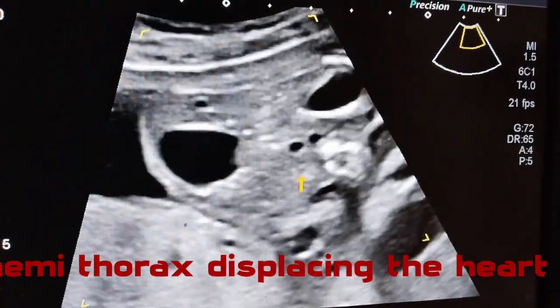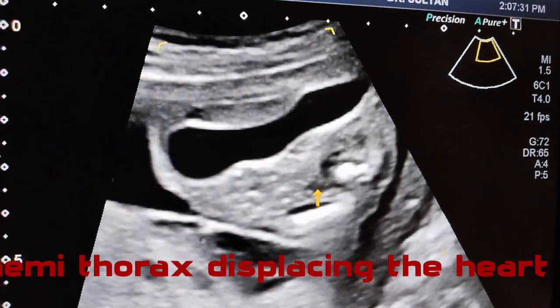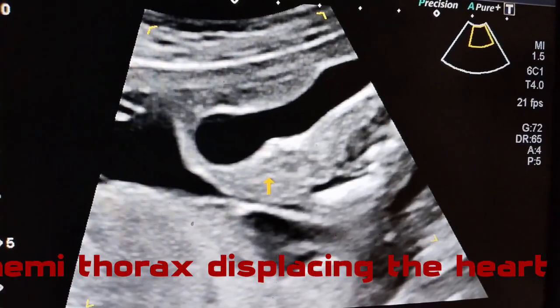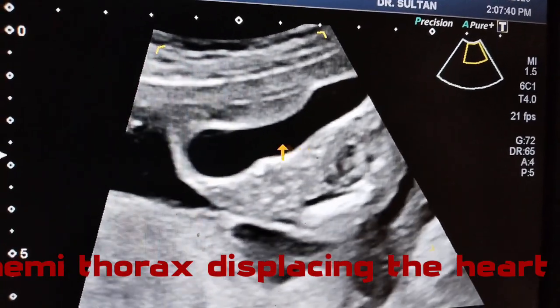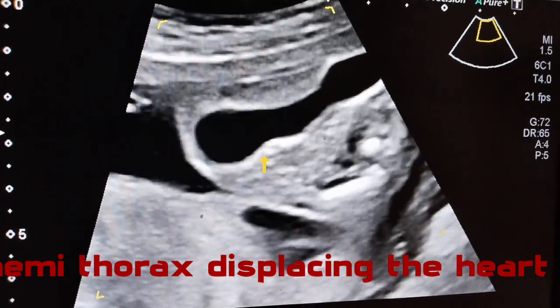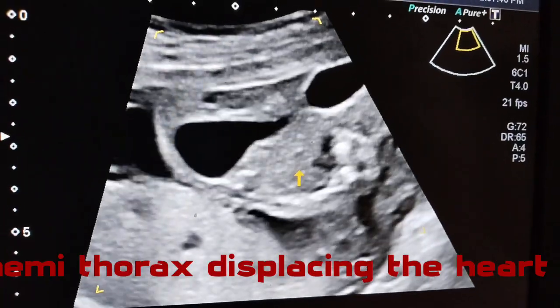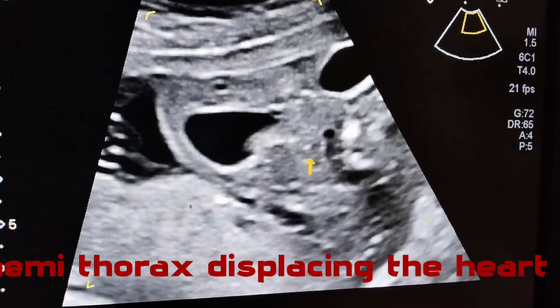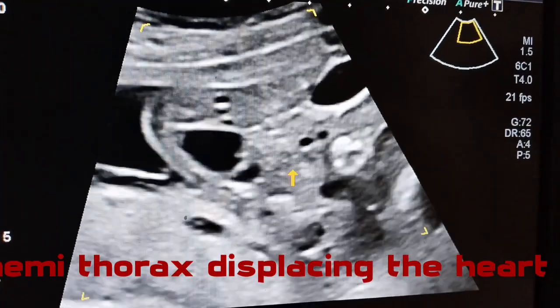Other differential may be duodenal stenosis. But in the duodenal stenosis, there is to and fro motion of the intraluminal contents, fluid. Here I have not seen that, and also some fluid or gas is seen in the distal small bowel loops.